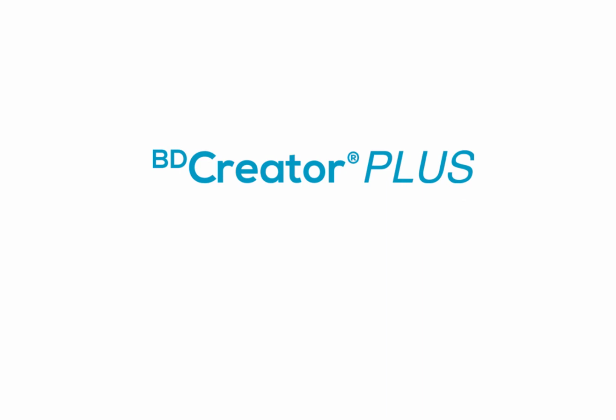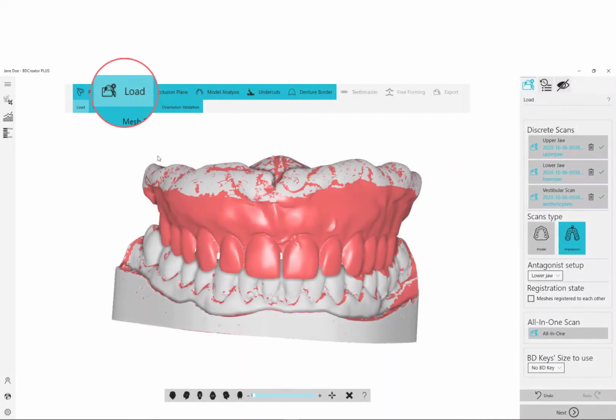In the following video we would like to introduce you to the new features of the software. With the BDCreator PLUS, you can now also design total prostheses in the upper or lower jaw. Let's start importing the data.